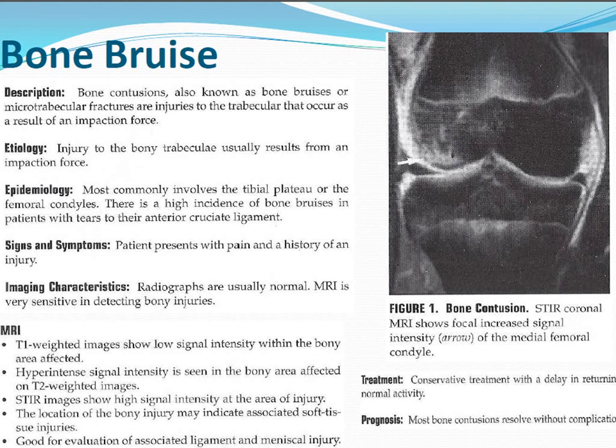So you'll definitely be seeing these sometimes for evaluation of knee pain, sometimes in combination with other injuries, but sometimes on their own. And so occasionally someone will come with this suspected abnormality on the X-ray. There's some subtle changes that you can look for, but once you see it on MRI is when you can make a really definitive diagnosis.